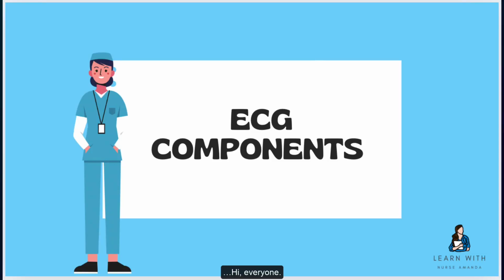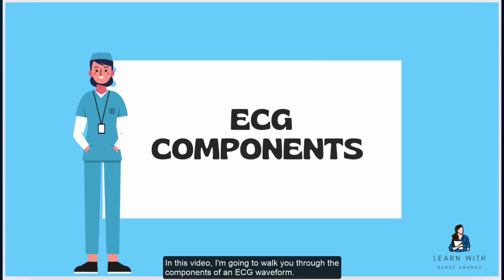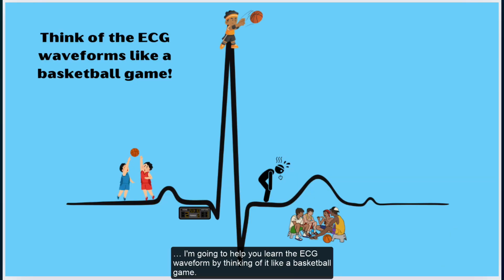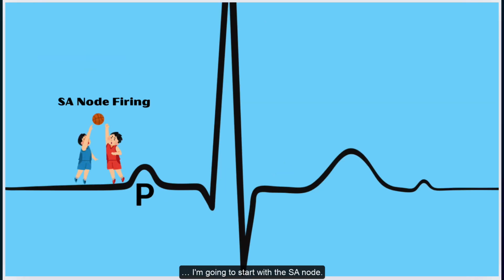Hi everyone. In this video, I'm going to walk you through the components of an ECG waveform. I'm going to help you learn the ECG waveform by thinking of it like a basketball game. I'm going to start with the SA node.